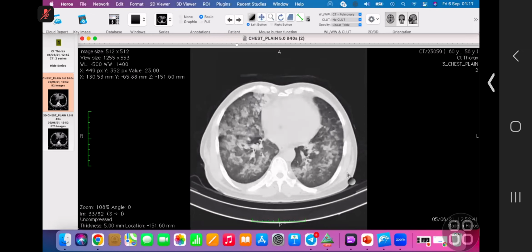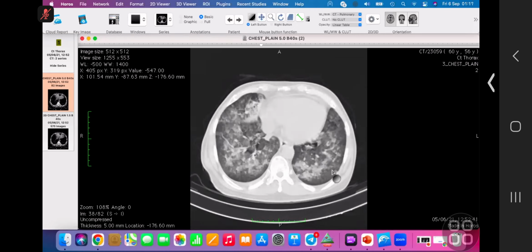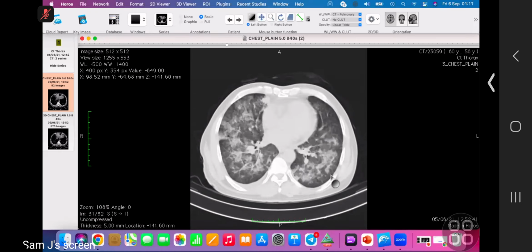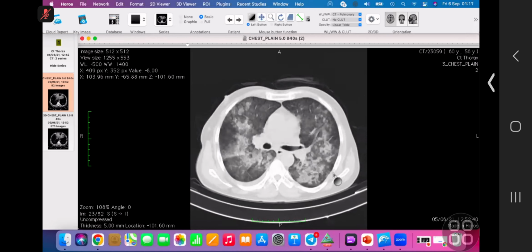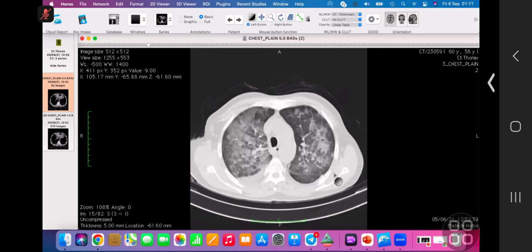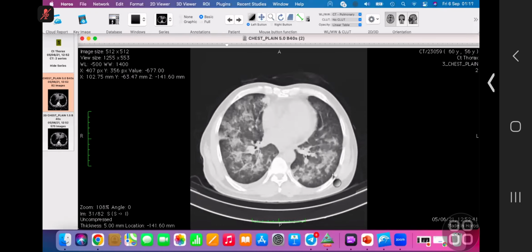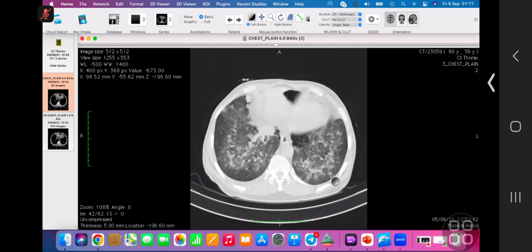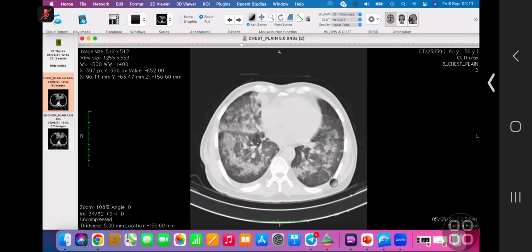Yes. So I'm checking if there are a few air cysts. There is one at the left lower lobe, and no other cystic lesions. There is a right-sided pleural effusion. Both hila seem bulky, but in my routine practice, I would check for lymphadenopathy in the mediastinal window. There is some consolidation at the medial segment of the right middle lobe as well.